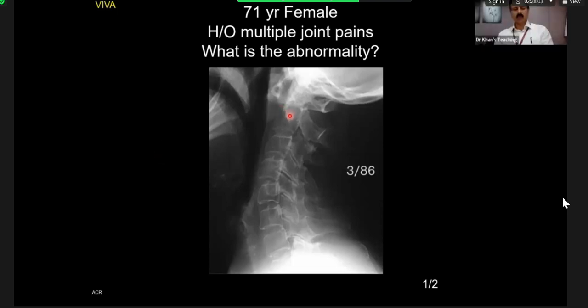Excellent. Can I stop you there? So this has been pointed out. This is the anterior arch and this is the dens, and this distance is increased. In the exam, of course, you can tell the examiner that you want to measure it. If they want you to measure, they will ask you to do it. Otherwise, they will simply agree with you because they have got limited time. Having said that, candidate 3, what is your conclusion?